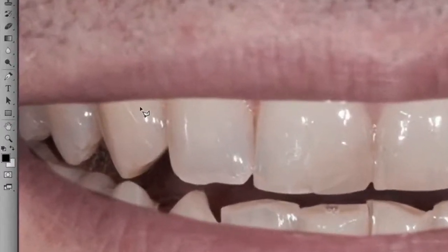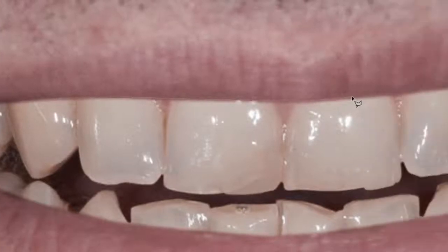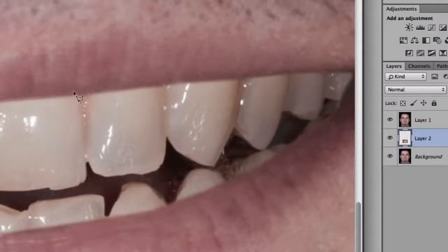All right, great. I'm going to come down here, and I'm going to click. What you want to do when you do this is click and capture just a teeny bit, a pixel or two of the lips. This is going to take a minute or two to do this particular selection. The other selection I wanted to be just inside the lips when I was using the liquify tool, not getting any of the lip.